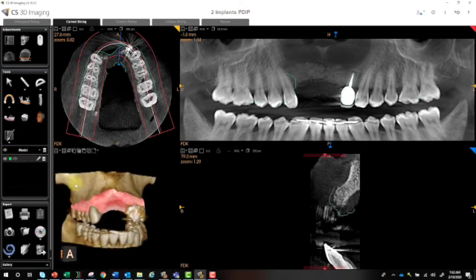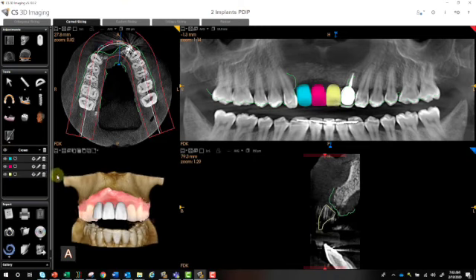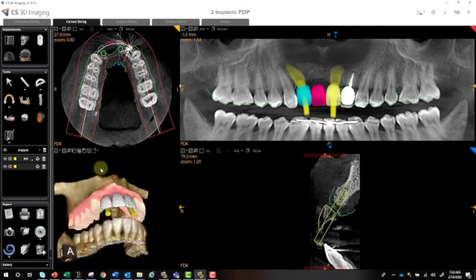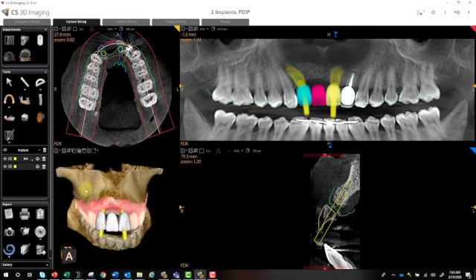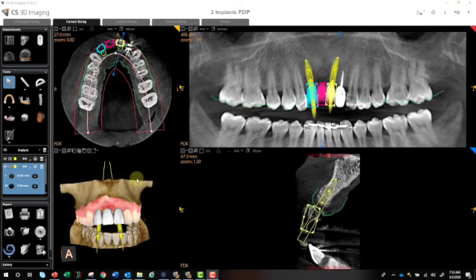our digital impression scan and crop out some of the CBCT so we can visualize this a little better, add our crowns, and now when we place our implants, of course, we have a much better visualization of where to place them, angles, and so on.